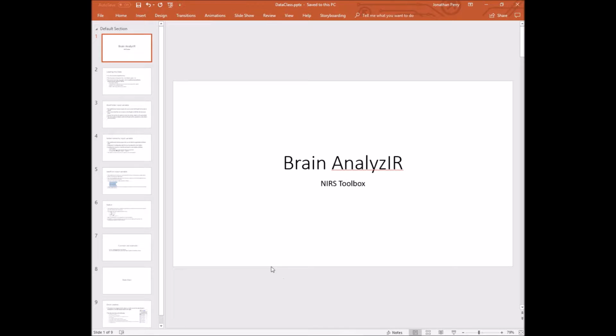Hello everybody, today's video is going to be about the NIRS Toolbox, or now it's called the Brain AnalyzIr, with the IR for both infrared and the phonetic ending. This video will be about loading data into NIRS Toolbox.